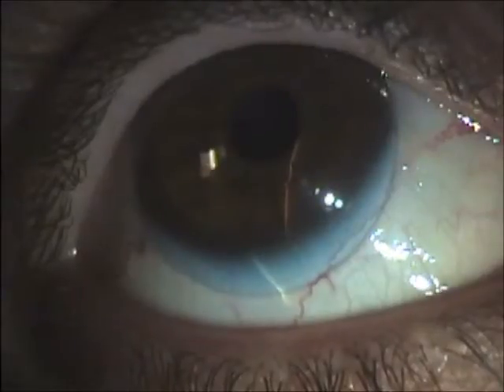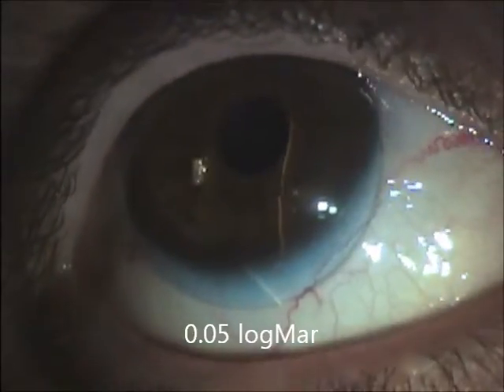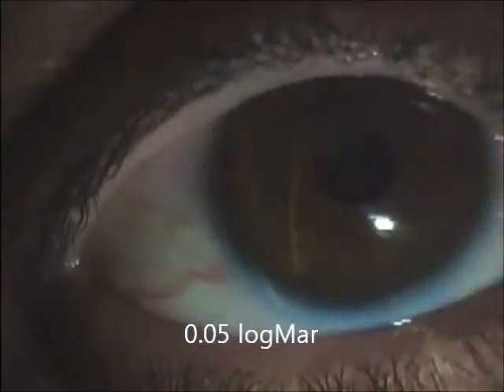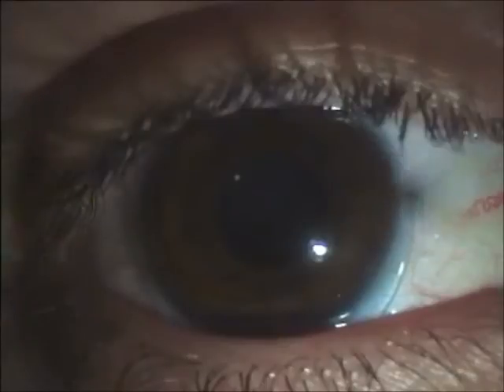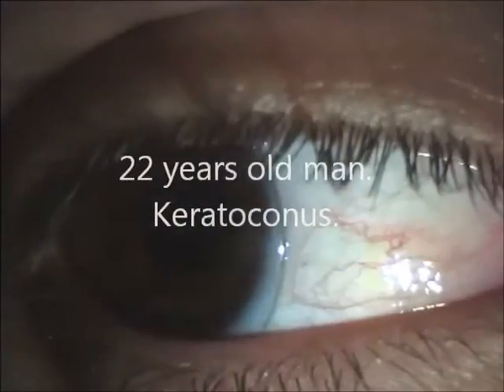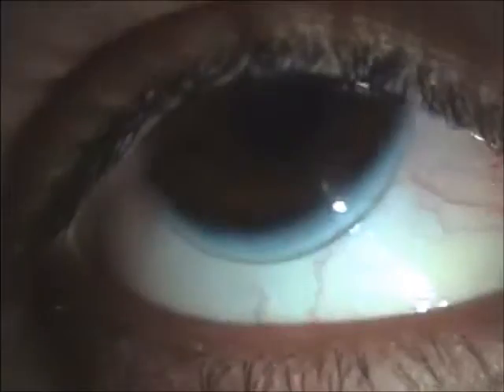Two last cases, father and son, with keratoconus, 53 and 22 years old. The first had poor tolerance to rigid gas-permeable contact lens, and the second did not have good visual acuity with the hydrophilic lenses.